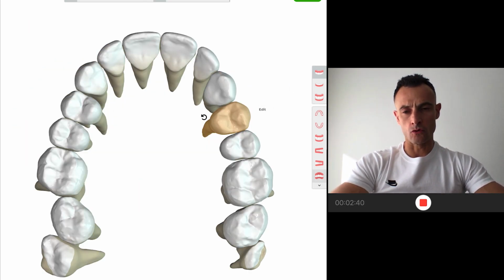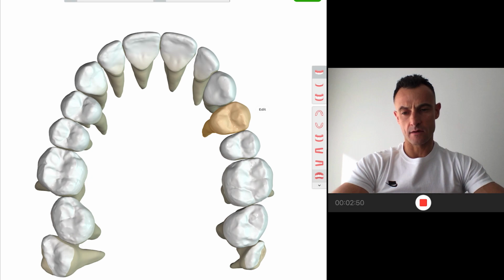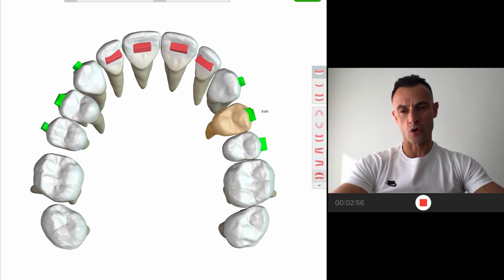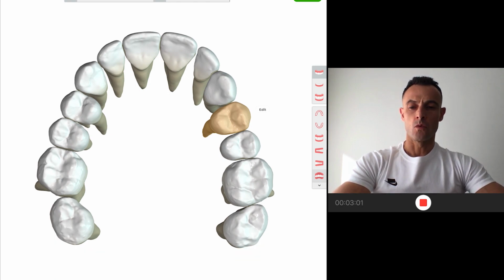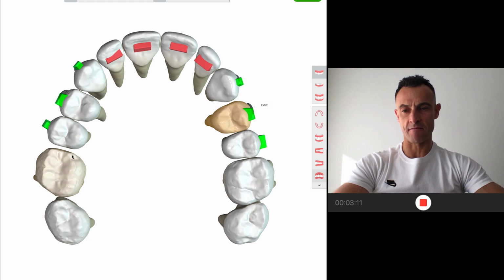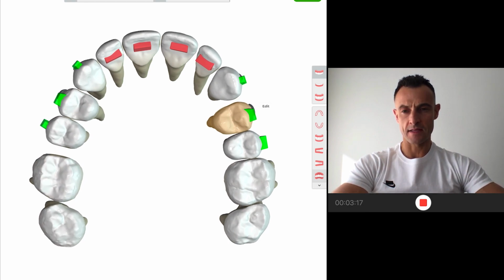So what I'm going to do here is plan the extraction of both wisdom teeth. So extraction, and I start with the movement. And what I'm going to do is the upper molar distalization protocol every 4 aligners. So starting with the 7: 1, 2, 3, 4. Now, as you can see, I have 1 millimeter of space. I continue 1, 2, 3, 4. I have another millimeter. It is 6 and 5: 1, 2, 3, 4, 5, 6, 7, 8, 9, 10.